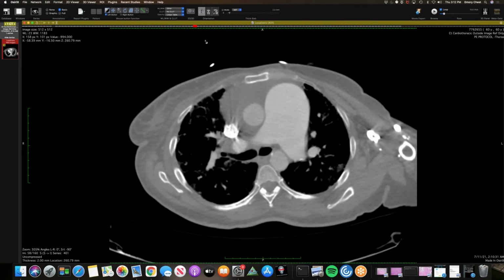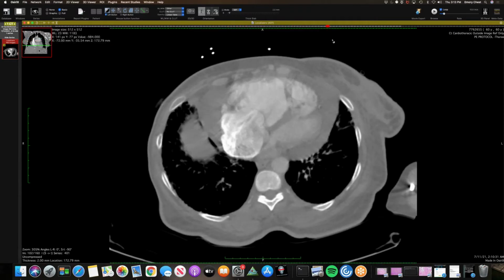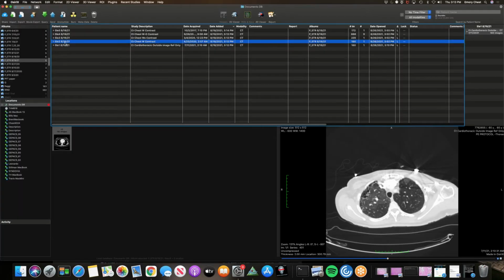To be honest, I don't remember the pulmonary hypertension details of this patient. I'd saved the case from a while ago just for the lung parenchymal findings. But yeah, it's pretty impressive. I kind of overlooked that. Yeah, it's pretty severe. So that's one.